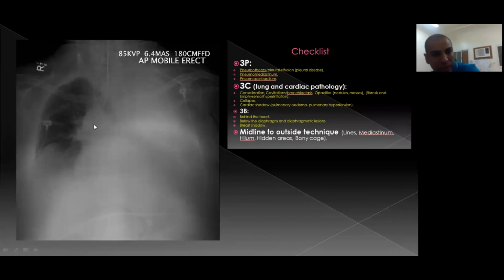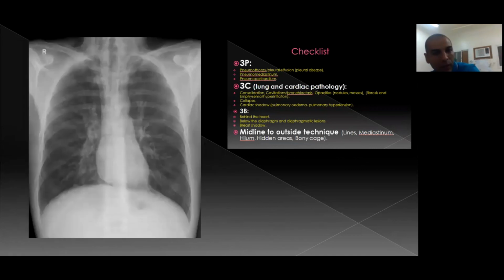The endotracheal tube is positioned in the right bronchus, so totally occluding the left bronchus. One of the emergencies that we see at any time. Malpositioned endotracheal tube. We need one from the surgical department because this one is an emergency and very easy to identify.